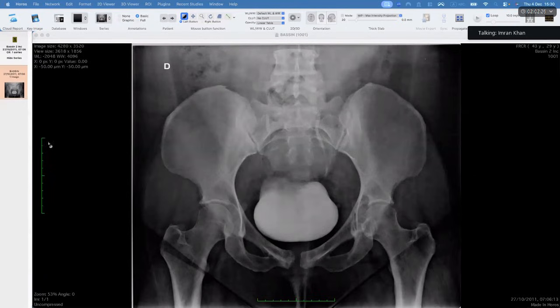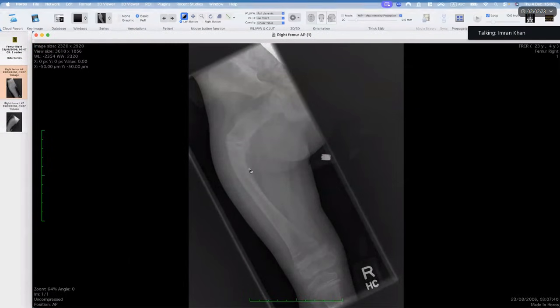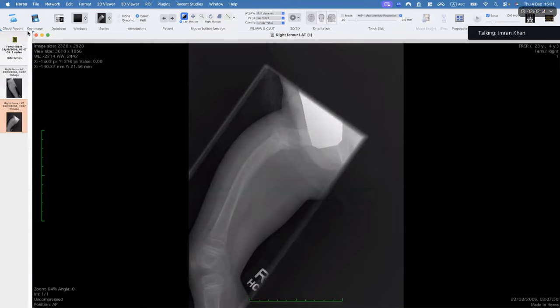Okay, the last case, this one you nailed it. Excellent pass. You knew all the answers. This is pseudoarthrosis, gracile bones with reduced bone density, osteogenesis imperfecta. These striped lines or dense metaphyseal bands are related to bisphosphonate therapy. Okay, no issues here. You get the highest maximum mark that you can get for this one.